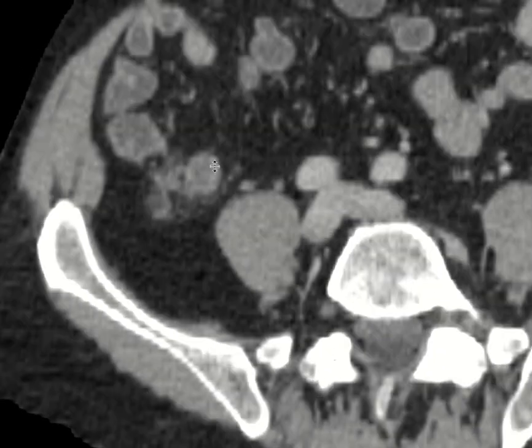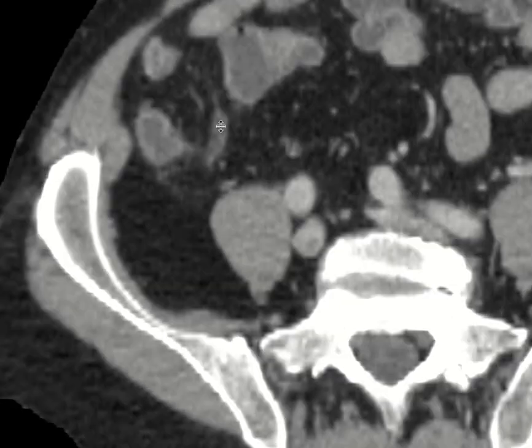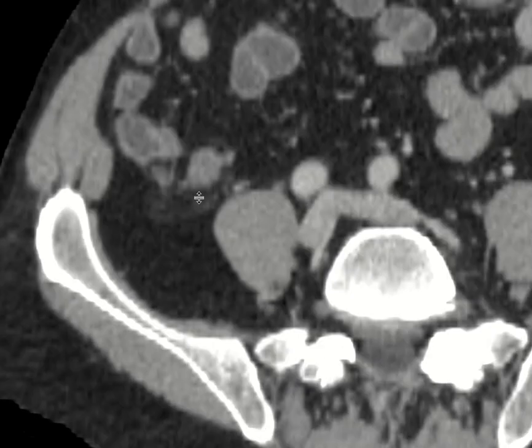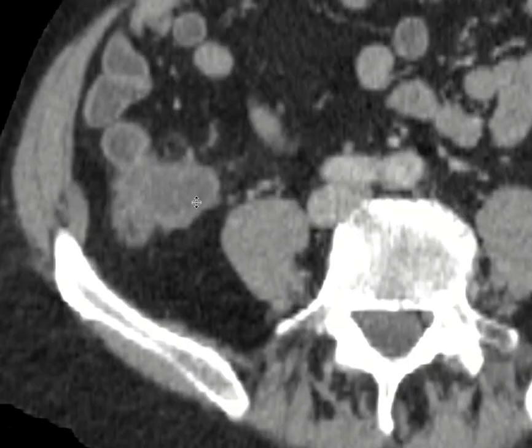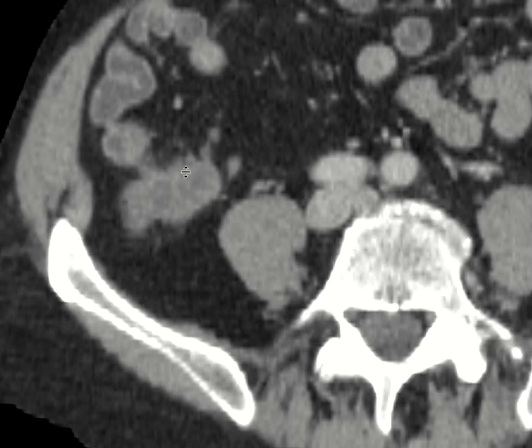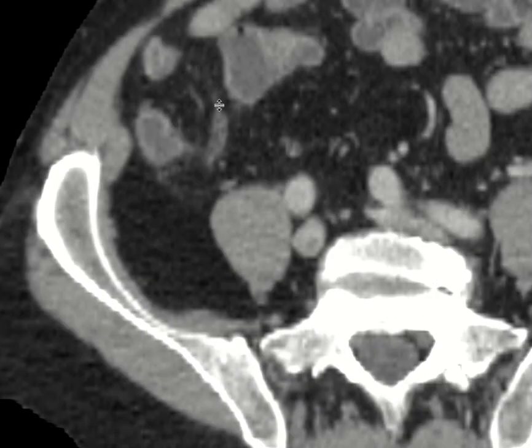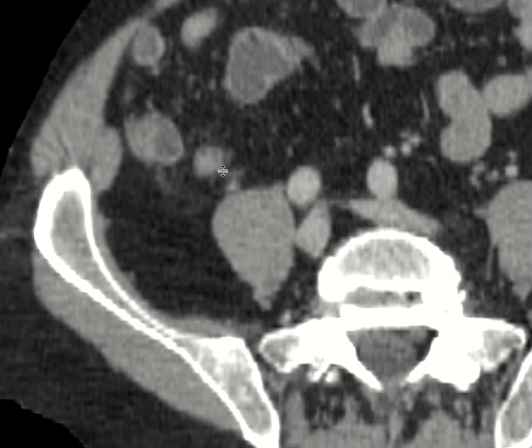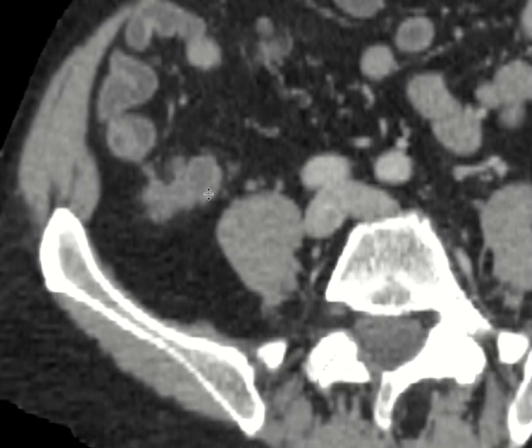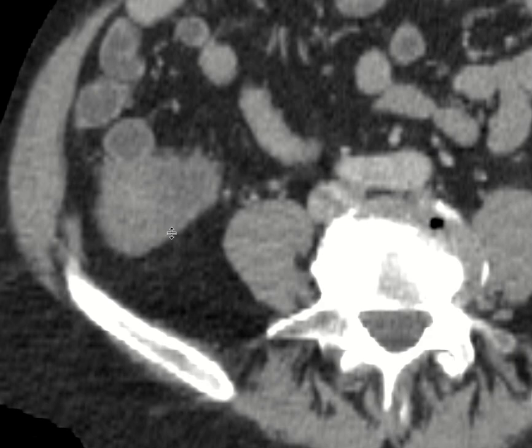If we follow the appendix out more distally, we can see that it really thins out and looks more normal appearing at the very distal most portions. And so that would not be consistent with appendicitis. When you have appendicitis, you usually have something blocking the base of the appendix, and then the distal parts become dilated and they dilate all the way out. In this particular portion here, we're not seeing dilation in the most distal portion of the appendix, so that wouldn't make sense for that.